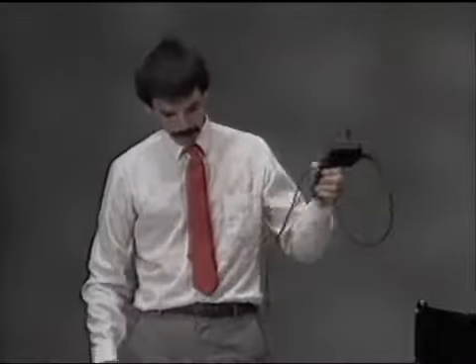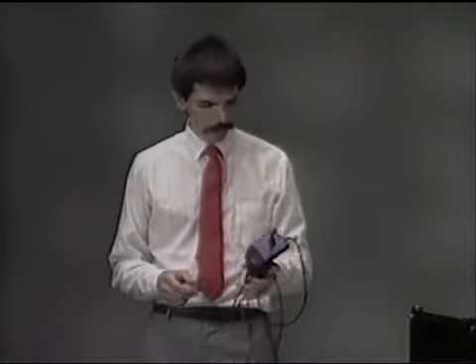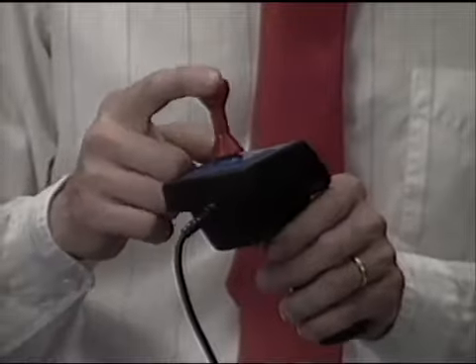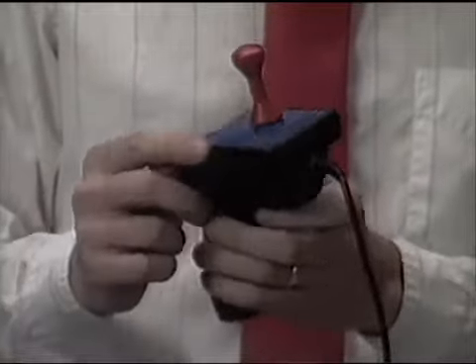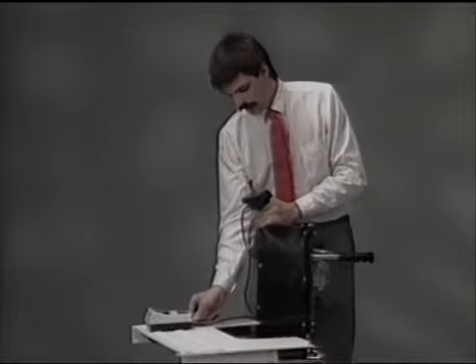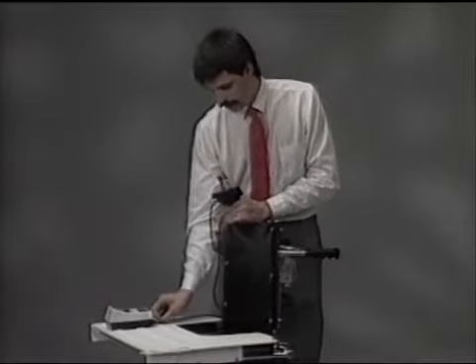To give you an idea, these are specialized joysticks designed for people to utilize both computers and power wheelchairs, and they run between $100 and $200. Now this one I got from a specialty company called Toys R Us, and it runs for about $9. It can be plugged into this or any Atari computer or Commodore computer, and allows me to operate this power wheelchair.